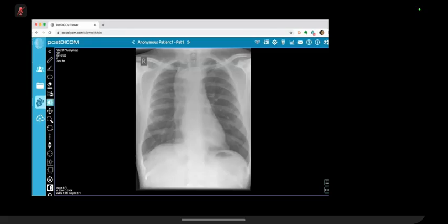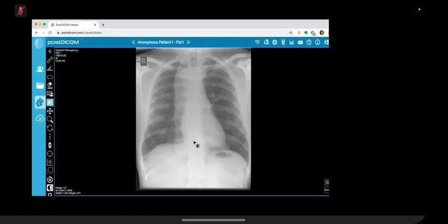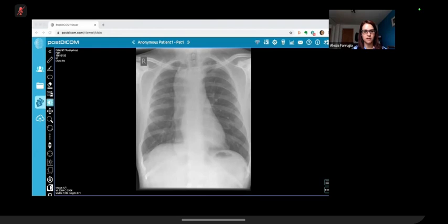So I think we are dealing with a case of achalasia. Next step would be performing an upper GI fluoroscopic study or a CT scan. They would still need an upper GI direct visualization. Of course, to exclude masses.